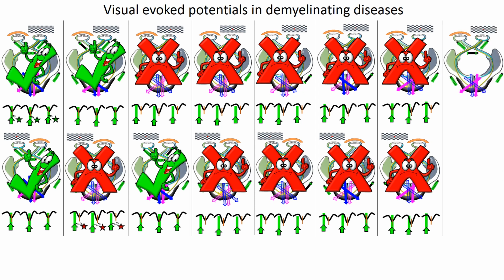The next figure I am introducing depicts chiasmatic demyelinating lesion being tested using right eye stimulation. This produces a delay in left occipital activation since the electrical activity cannot travel across the chiasm to the opposite hemisphere, thus producing delayed right parasagittal P100 and delayed sagittal P100, but normal left parasagittal P100.